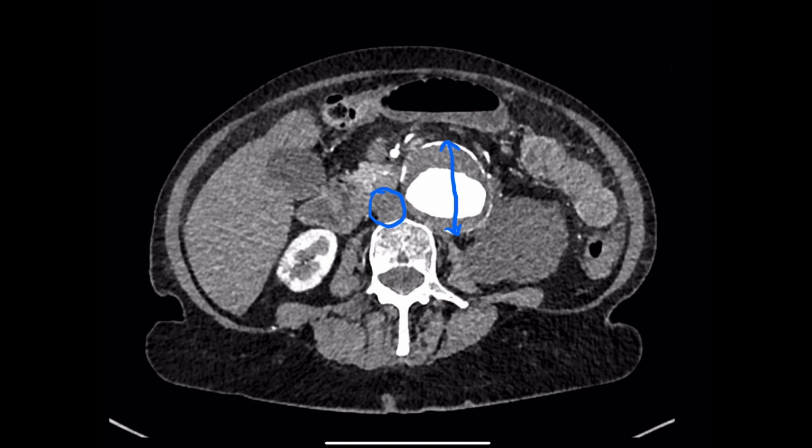When you inject IV contrast, it's injected as a bolus, perhaps 80 to 100 milliliters, at about 4 mils a second, and it courses from your antecubital fossa back to your heart, and then out to the arterial system. This particular CT scan has been caught probably about 20 or 30 seconds after that initial injection of contrast. Hence the bright white.